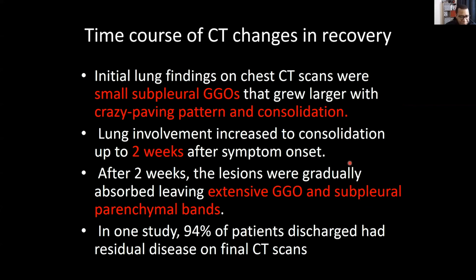Because we know a lot of times ground glass opacity is due to infiltration of the septum. The secondary pulmonary lobule has a septum that surrounds it, and people call that the interstitium, right? So sort of like an interstitial edema kind of thing, right? But as you infiltrate into the alveolar spaces, like we talked about, when you have loss of integrity of the endothelial and epithelial barrier, you flood fluid and hyaline membrane into the alveolar spaces, and this typically results in more consolidation. So this takes some time.